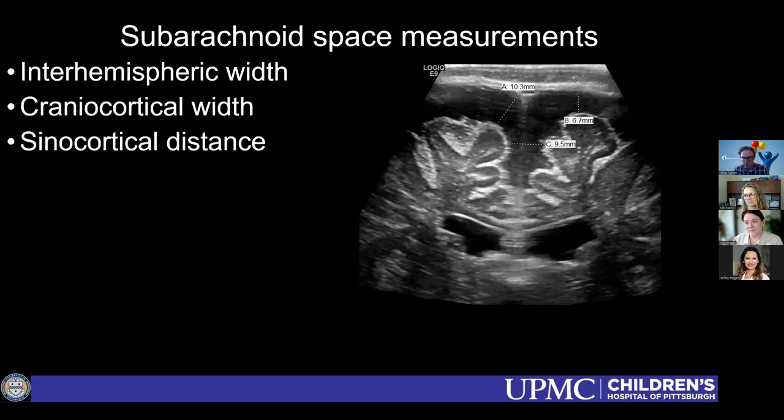Before we did these measurements, people were just saying, yeah, they look a little bit big, but it's not that objective. So I don't think the data on this is that great per se, but I think it's better than nothing. So we do those 2 measurements just to give us a little bit more objective data.